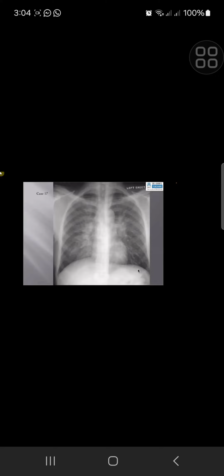I went into the lymphangitis, which was probably a poor choice. I mean, it can happen in the exam. Your mind is in a race to get to the diagnosis, and then you just race ahead, and you're there at a really fast pace. But you can always retract. You can always go back to what you said and refine it. If the radiograph stays there, most of what you said is correct. You just have to refine it a bit more and bring out some more findings.